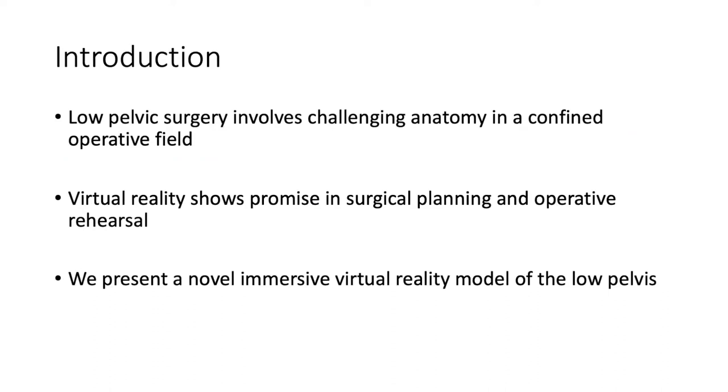Low pelvic surgery involves challenging anatomy in a confined operative field. Virtual reality shows promise in surgical planning and operative rehearsal. Herein, we present a novel, immersive virtual reality model of the low pelvis.